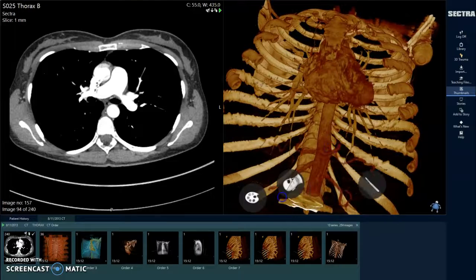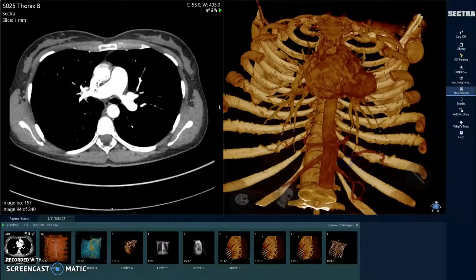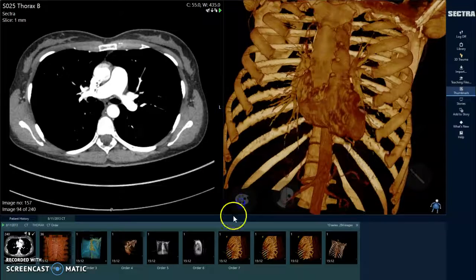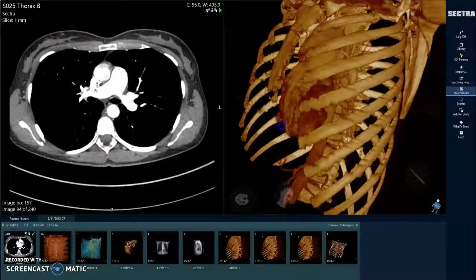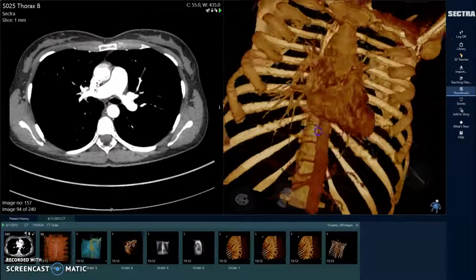We have, obviously we have some celiac trunk and SMA. Let's see if it captures this. There we go, so there's SMA there. There's celiac trunk here. We've got the heart itself. So remember, this is because this is a contrast agent in the blood, this is kind of like an internal mold of the main chambers.